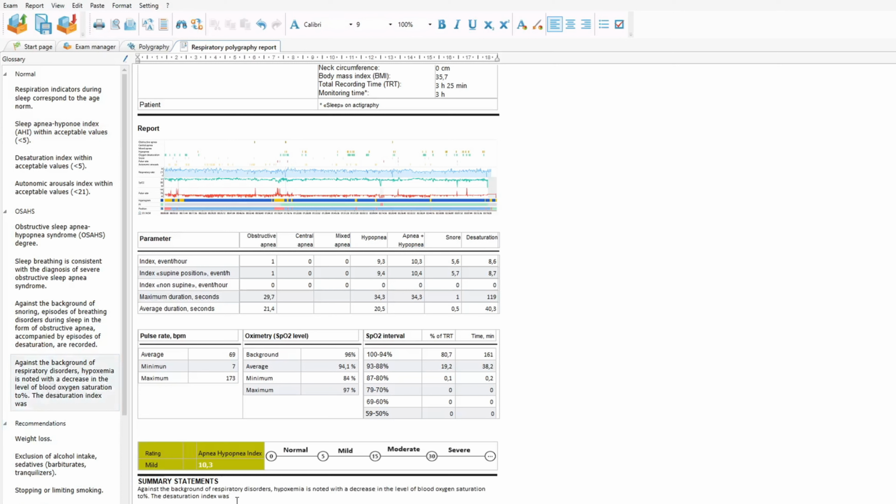This software is convenient and easy to use for physicians who conduct examinations using the home sleep apnea testing device Snorlex. The Snorlex device is also attractive to patients due to its mobility and compactness. This allows patients to obtain records at home independently in a comfortable environment.